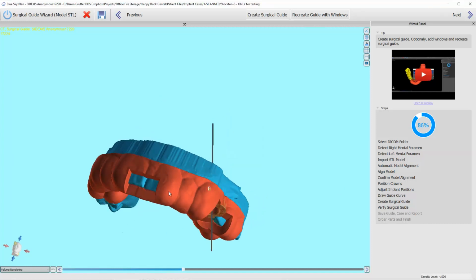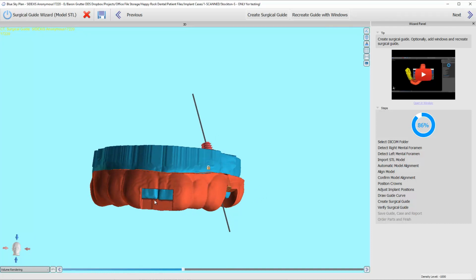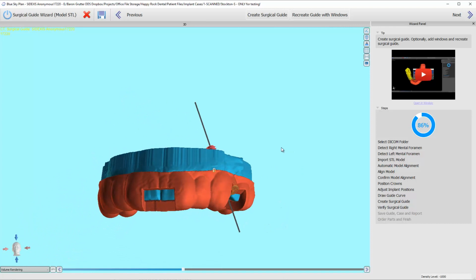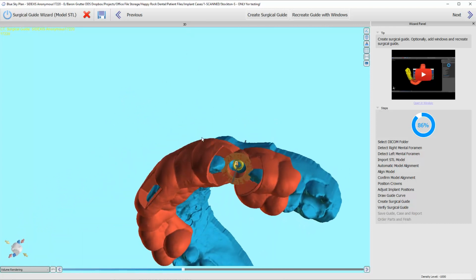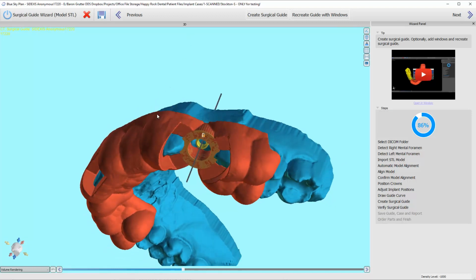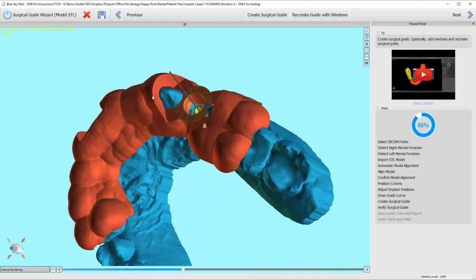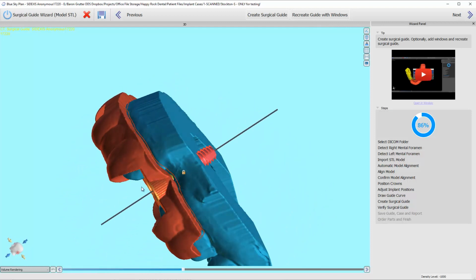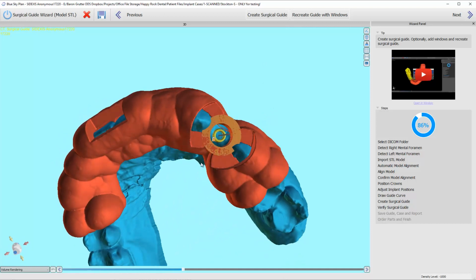All right, so here is my surgical guide. You can see the little window. When I seat the guide, I'll see the teeth in there, and I can tell if they're sitting pretty darn close to flush. That means it's seated all the way. And here's my guide hole. One thing you're looking for is that if you notice these teeth stick out here on either side, that's just because the guide tube was down farther. And if you look, there's another circle in here.